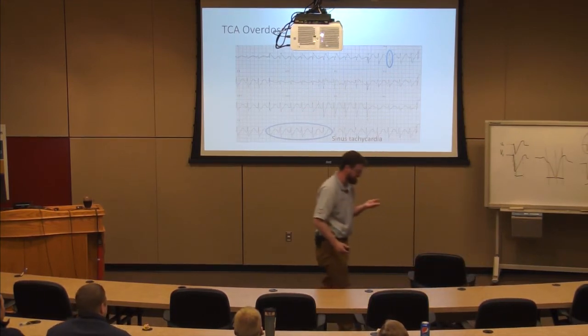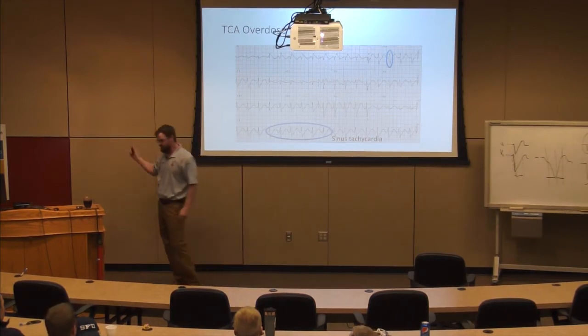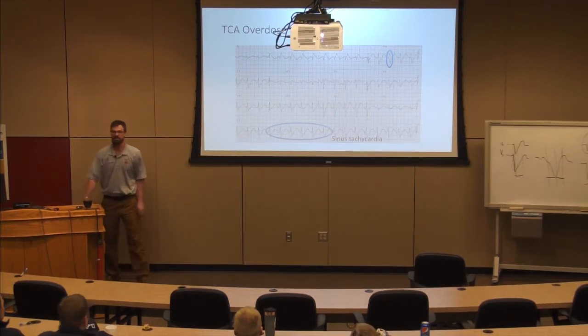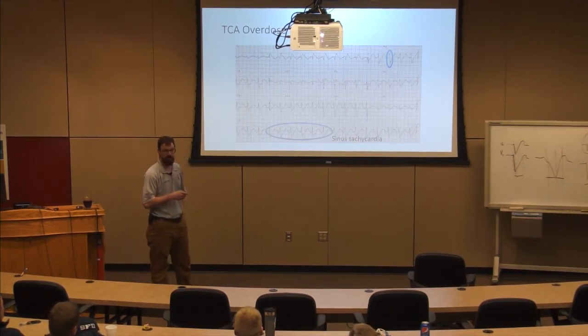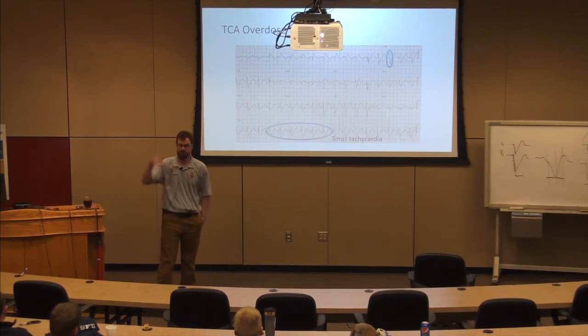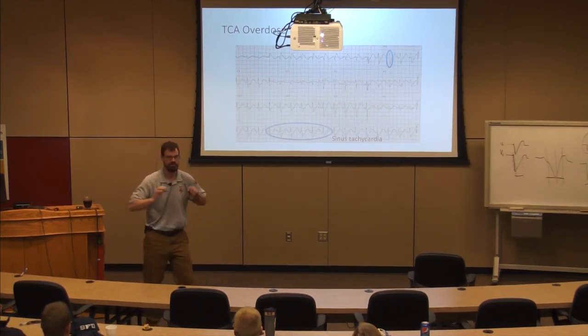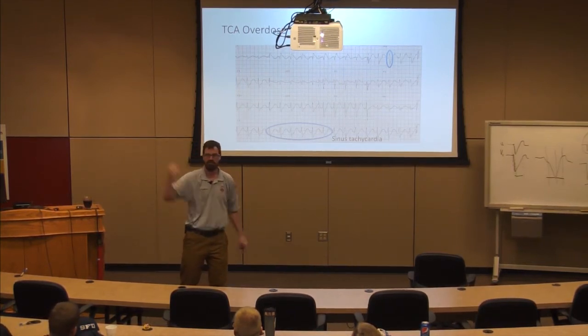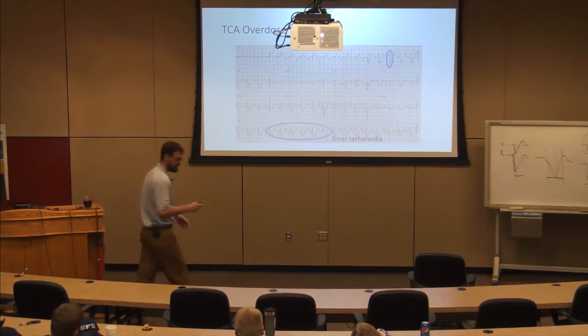We never pay any attention to AVR. We never pay attention to AVR, right? It's the lost lead. Remember, AVR almost universally is always down. The axis is always down, right? Because where's my positive lead for AVR? It's out in my right shoulder. Everything moves in this direction, right? So AVR is usually down, predominantly, okay?